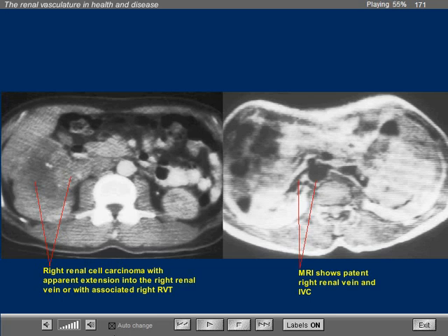So we can see, therefore, that the MR examination is more helpful to show patency of the veins, and that on CT examination, a mass at the level of the hilus not always represents a dilated vein. And the MR examination, by showing the lumen of the vessel, is more specific than CT in the diagnosis of renal vein thrombosis.